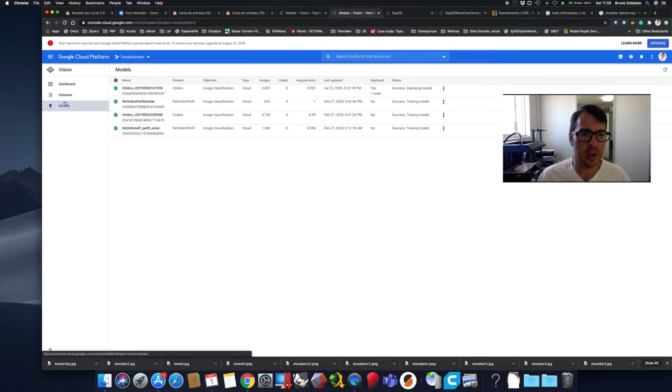It's in Portuguese, but my first model is this one, X-ray, that I taught my computer to give information about the incidence for shoulder X-ray, if it's AP view, lateral view, or axillary view. And then we enhanced our model to give more diagnostics. That is what we're going to show here.